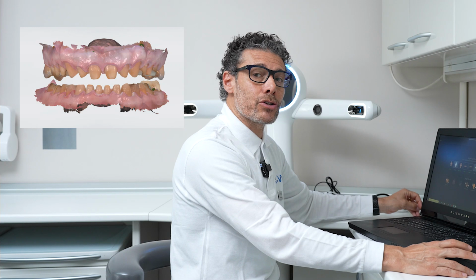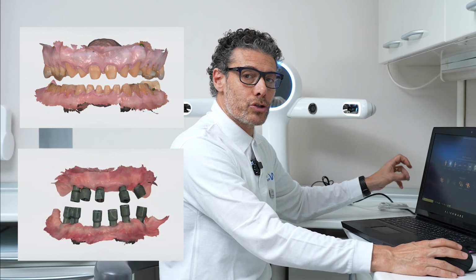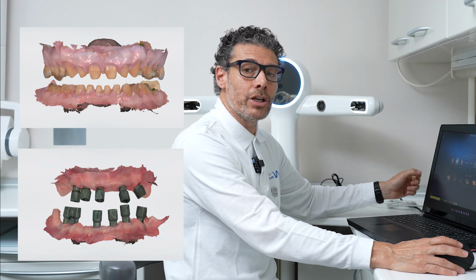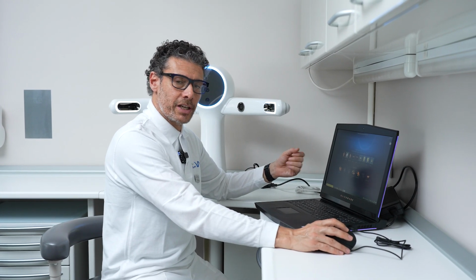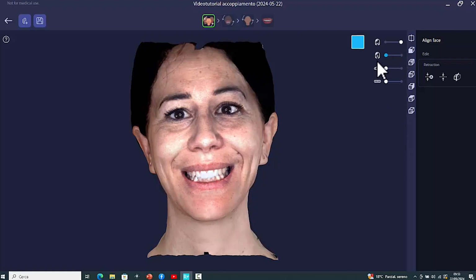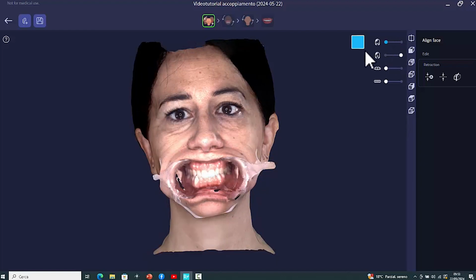In a dental implants case, the scans will include the ones with scan abutments. Once we have imported the scans needed for the superimposing, we go ahead in our RayFace software, we find the 2 facial scans with and without the cheek retractors, the upper arch intraoral scan and the lower arch intraoral scan.